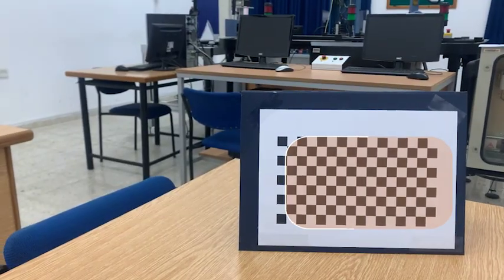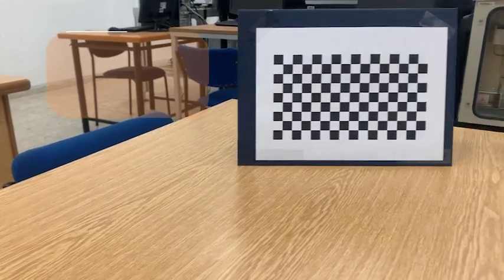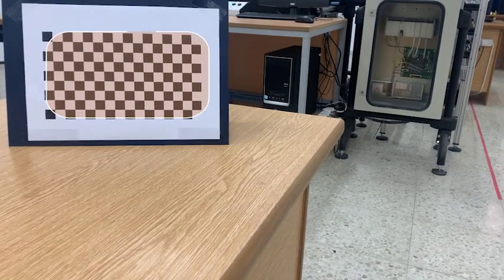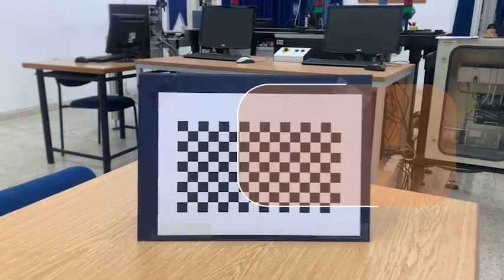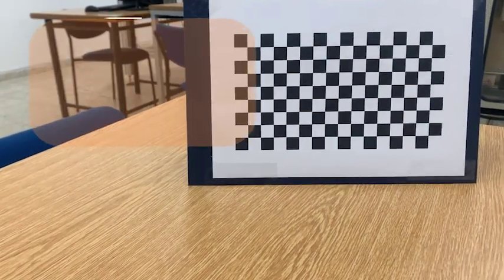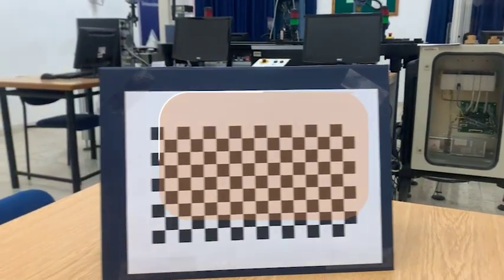Next, a checkerboard pattern printed and attached on a flat surface is positioned in front of the phone camera, which is going to be used for recording the video of the patient's specified movement practices later on. By recording this checkerboard at different angles and distances specified by the user interface guide, parameters regarding the focal length and lens distortion of the camera will be calculated by the application.